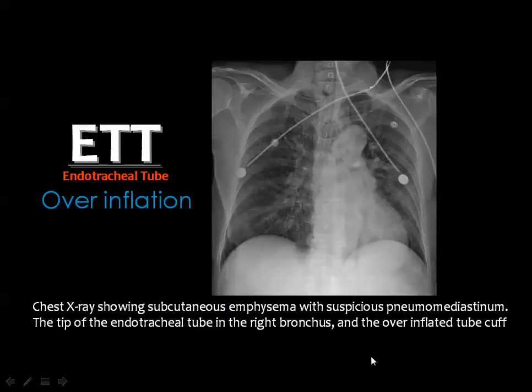And if you look carefully here, one of the difficult situations of interpretation of the chest X-rays in the ICU patients is the presence of too many devices, leads, and tubes. Then you have to verify each tube and line separately in order to judge its accurate position and the possible complications.